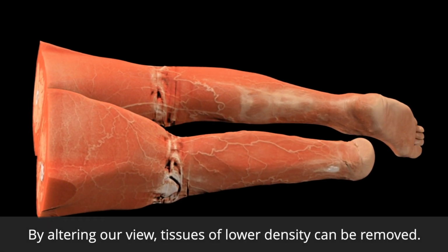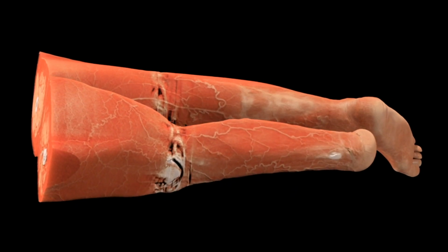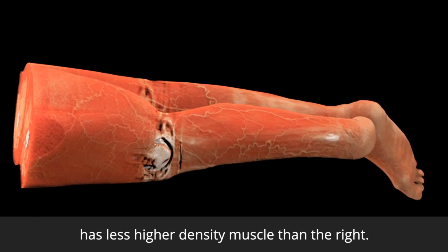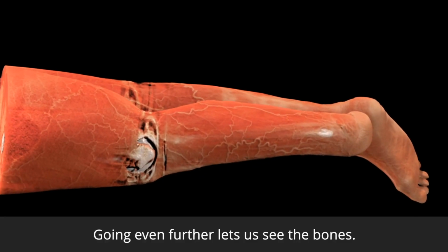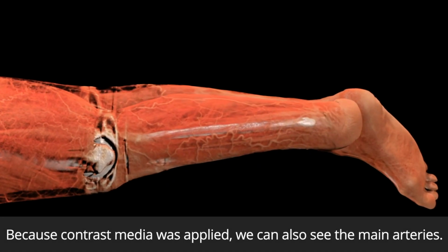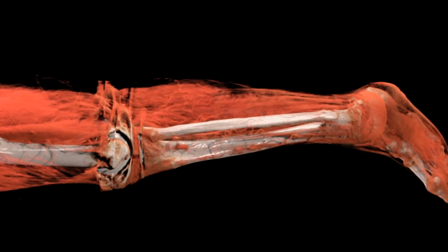By altering our view, tissues of lower density can be removed. We can see that the left lower limb has less higher density muscle than the right. Going even further lets us see the bones. Because contrast media was applied, we can also see the main arteries.